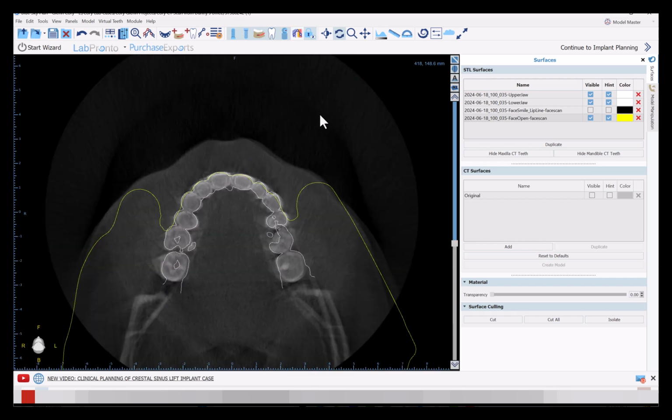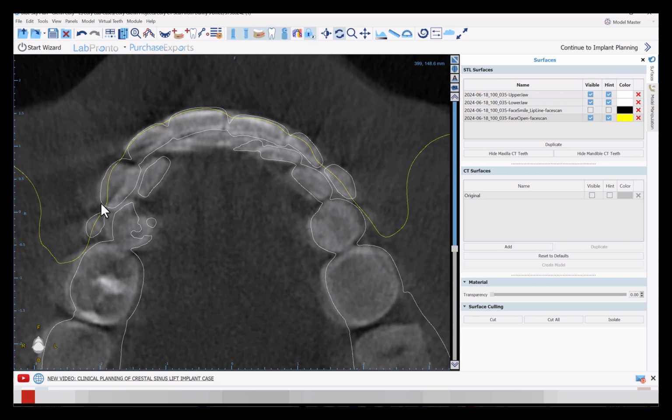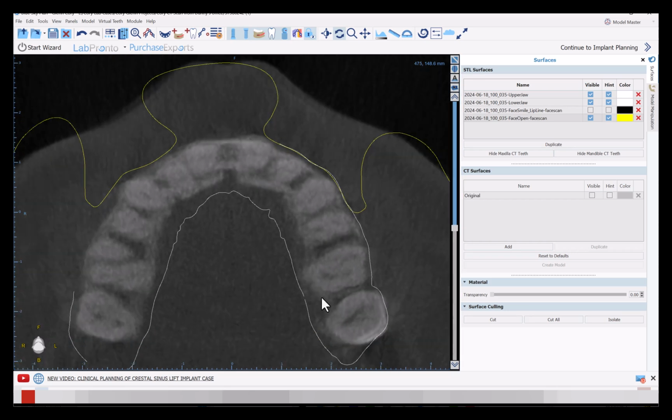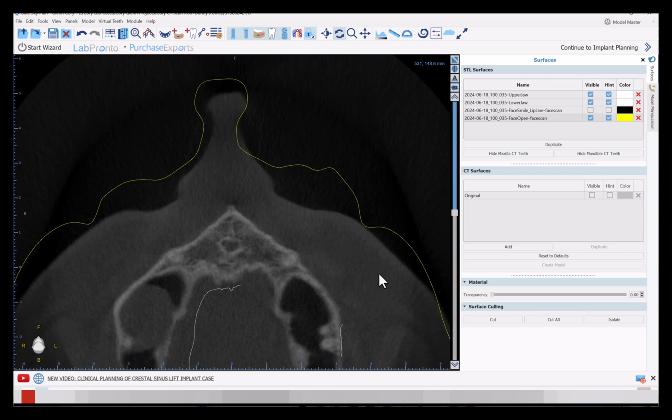Okay, so looking here, again, is it close? Yeah, but is it perfect? No, it's not. You see how these teeth are falling well outside of that? That's closer, but that tells me that I've got a little tipping somewhere. You can also try to look at soft tissue boundaries. So I can make out the soft tissue in my CT scan, and these clearly are not perfectly matched up, nor would I expect them to be because, again, it's retracted in the facial scan, so distorted soft tissue, and just at repose in the CT scan.